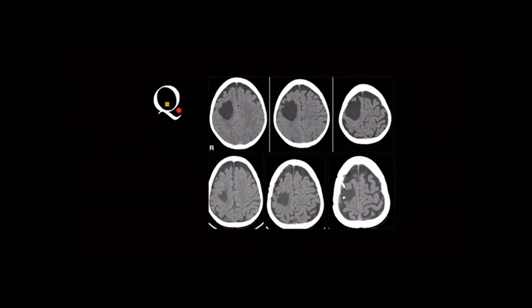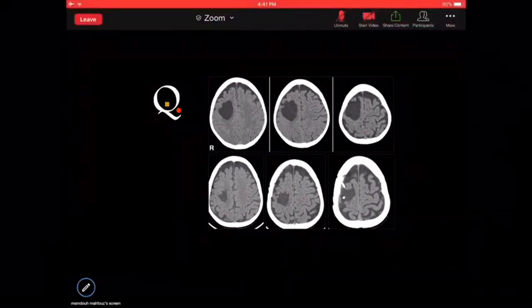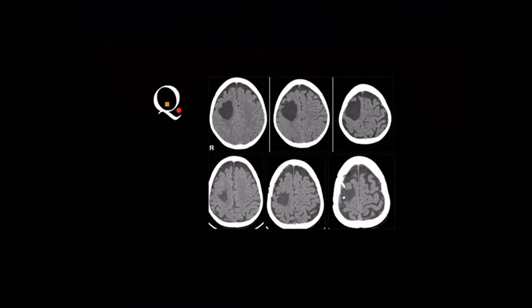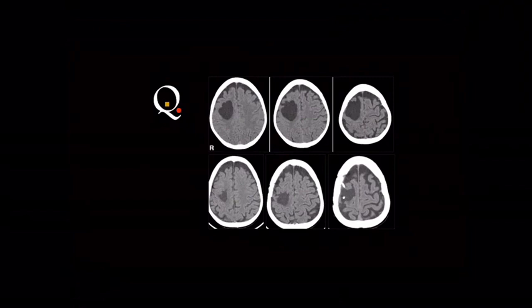Actually, this cyst is not included in the previous lectures because of its common presentation in the clinical practice. I included it here, and this is known as the neuroglial cyst, which is the simple cyst of the brain. And you remember that I have mentioned before that there is no intraaxial cyst apart from hydatid, but this is wrong. There is a cyst which is well known, that is the simple cyst of the brain. It is called the neuroglial cyst.